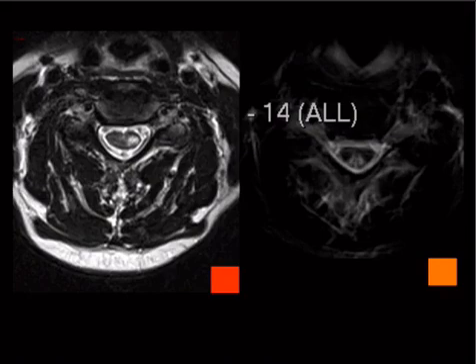The red one is just a little bit off to the side. That one is MS. And then the other one, the orange one, is a classic-looking thing, sort of like an inverted V. So that can be two things, right?